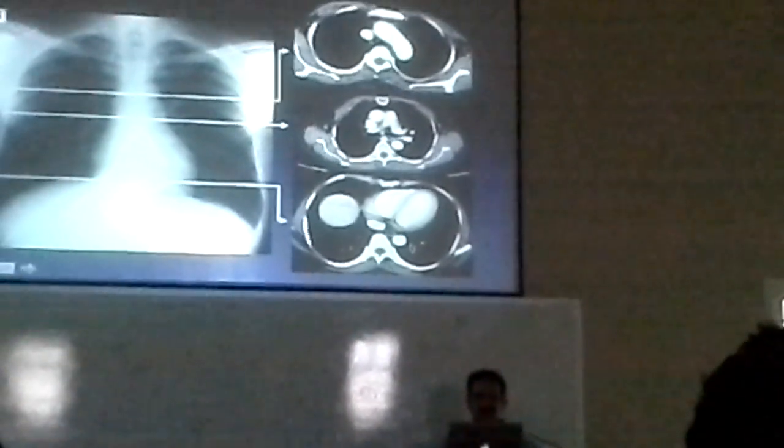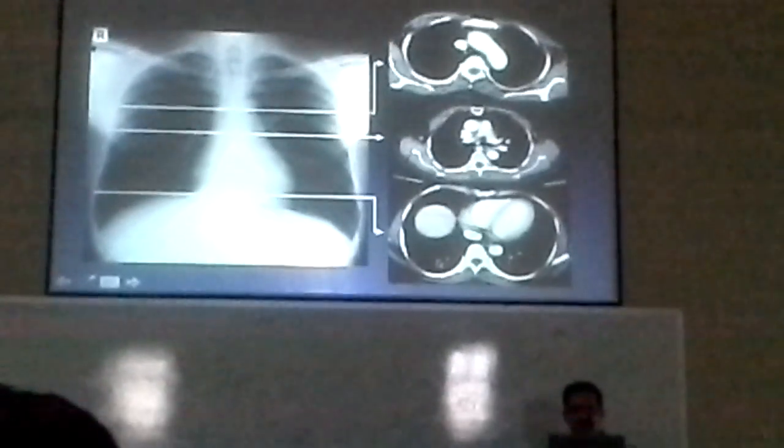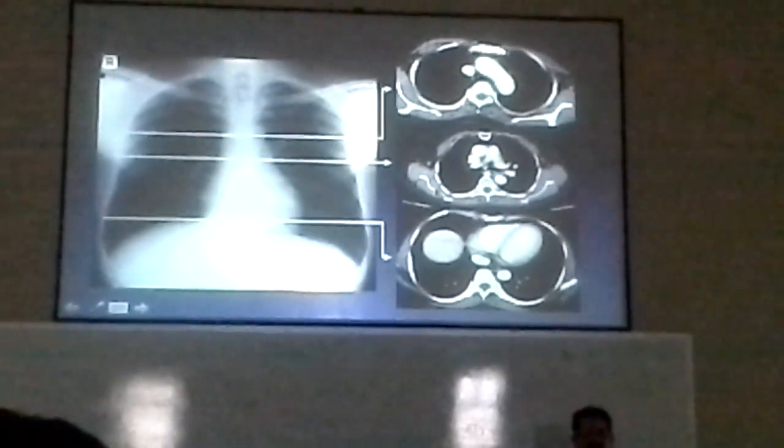Okay. And these are lungs. We are unable to see the lung because this is mediastinal window. Okay, what window is this? Very good. Again, this is CT of the chest, and this is lung window. We are unable to see the mediastinal structures here.